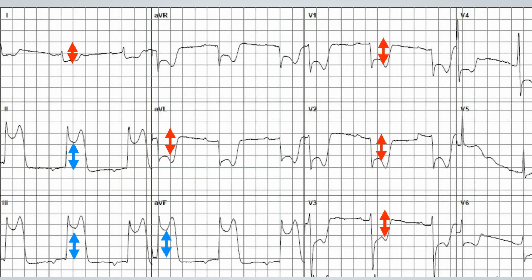The exact reasons that acute myocardial infarction produces ST segment elevation are complex and not fully understood. Normally, the ST segment is isoelectric, meaning that no net current flow is occurring at this time. Myocardial infarction alters the electrical charge on the myocardial cell membranes in several ways, resulting in abnormal current flow or current of injury, which then produces ST segment deviations.